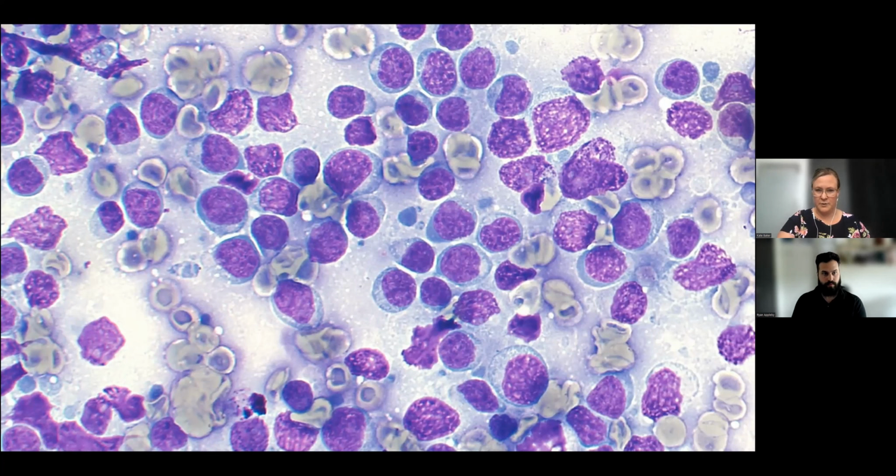So that's an important thing to remember because that oftentimes throws people off. Other characteristics of these cells are very lymphoid. There's nothing plasmacytoid about them aside from that little clearing. So we have to remember large lymphocytes can have that, and that helps us not let that lead us astray. So we've got all of these cells that are large lymphocytes.